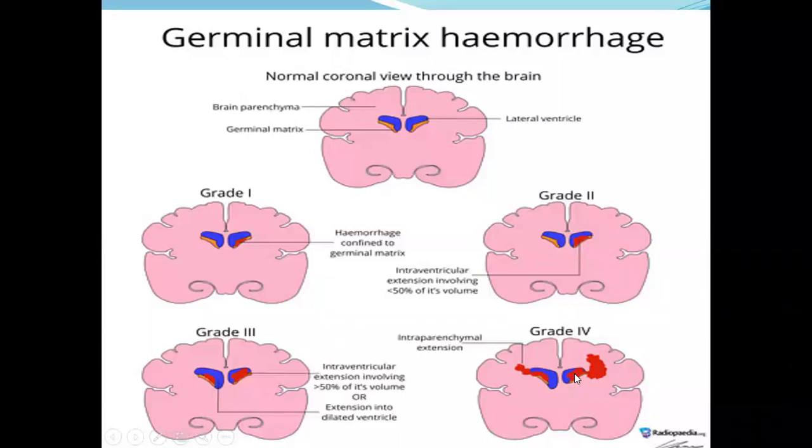But now it is thought that it's the grade 3 intraventricular hemorrhage that progresses: because it causes the lateral dilatation, it will compress the adjacent blood vessels, and then cause ischemia. This is why I don't like this grading system. It's accurate, of course, and a very good tool in monitoring the neurological outcome, but because of grades 1 and 2, that is why I don't like it, though it is very good too.